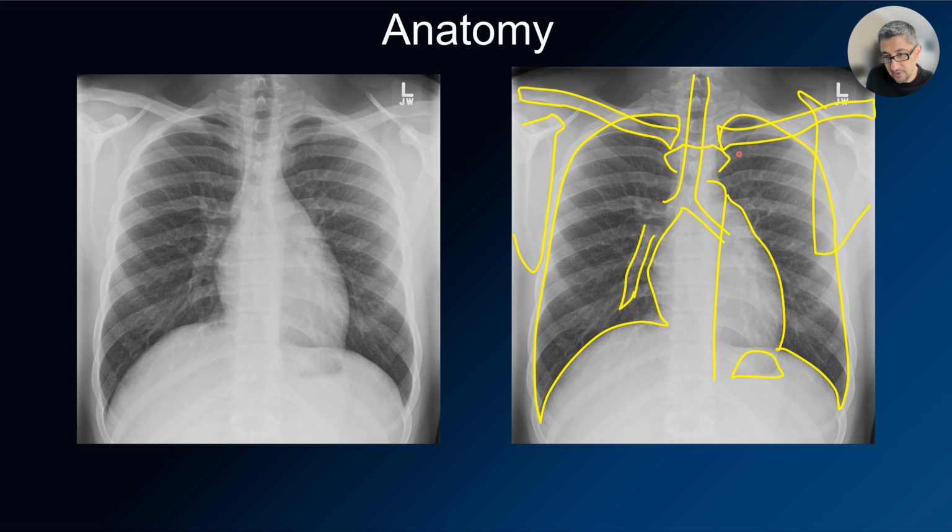the manubrium sterni, clavicles, and bilateral scapulae, and the fundus gas.